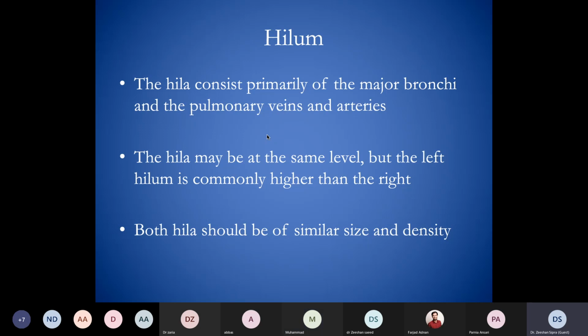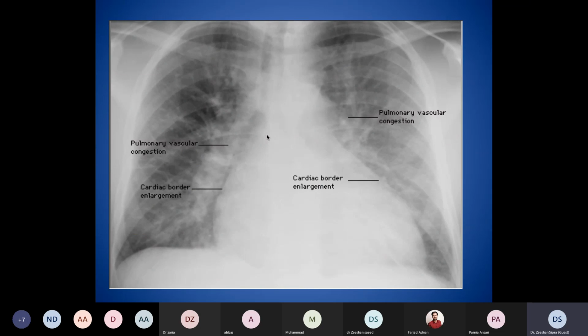Mainly, I'll be showing you different pictures of pathologies which are, for example, affecting both lungs and heart or the mediastinum. A complete case where we can appreciate what the findings are in that radiograph. Case based would be rather good, but I would be systematic initially, then we'll do it wholesome, inshallah.